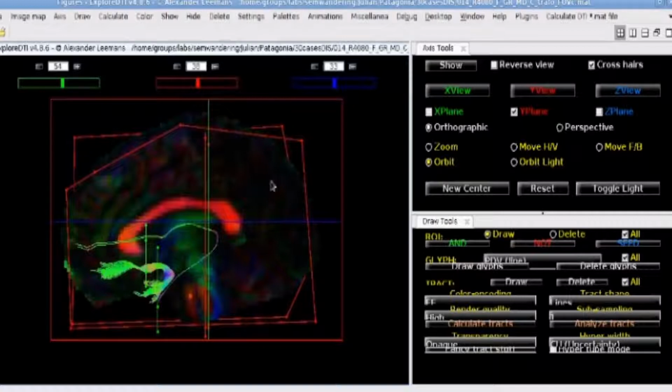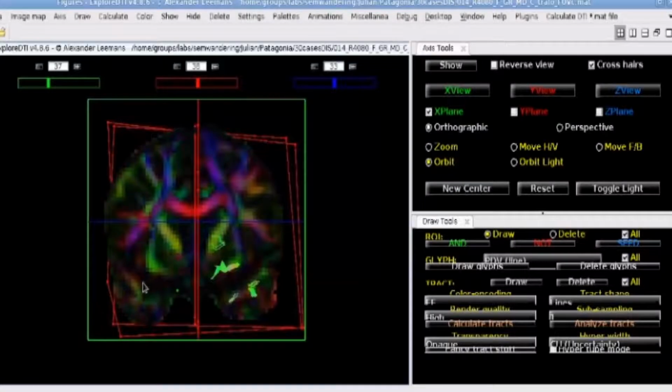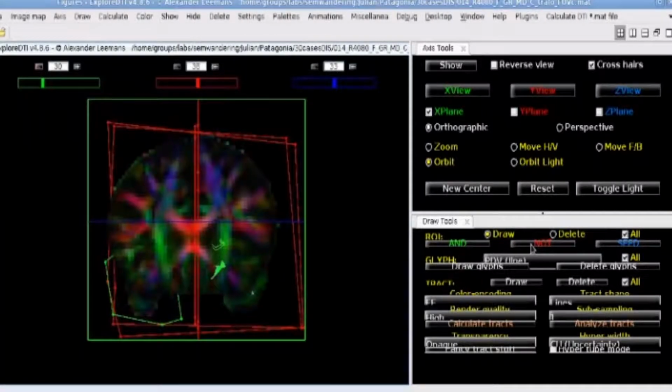If you look at a green bundle, you need to think that water molecules are going posterior to anterior or anterior to posterior. If you see that the voxels are painted in red, it's a scale of red because red, blue, and green form the three colors of the code.